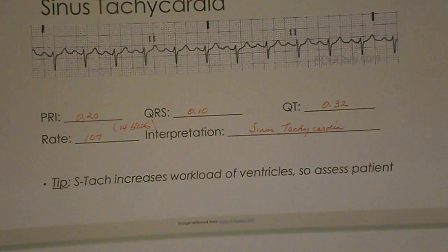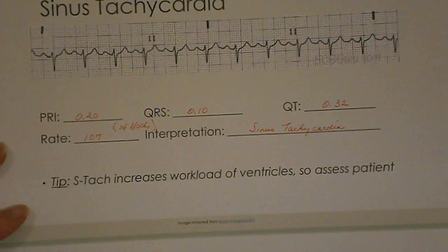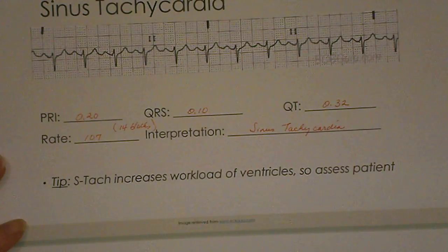The final rhythm that I'll go over on the sinus rhythms is the tachycardia from your text. Some nurses confuse this with atrial flutter, but I'll tell you that it is not, because it is not an exact waveform. But we're going to go through the same 8 steps of rhythm interpretation.